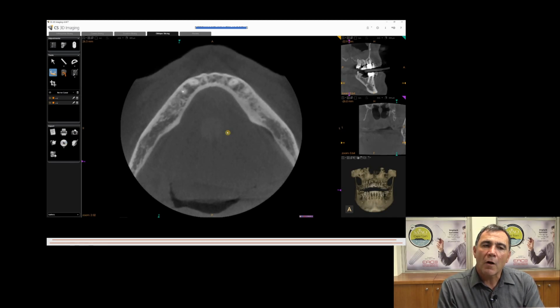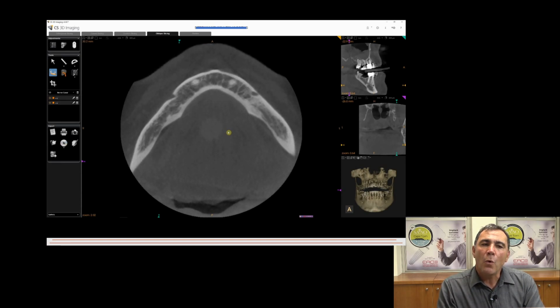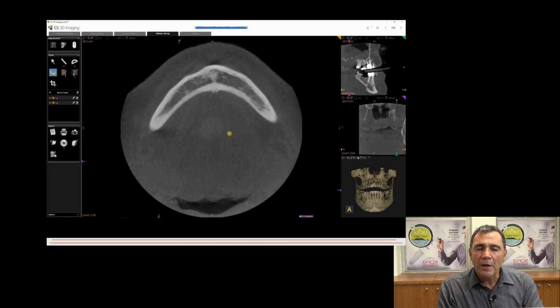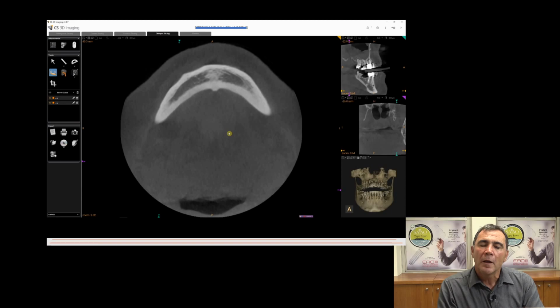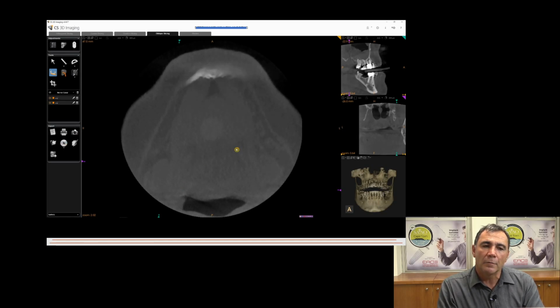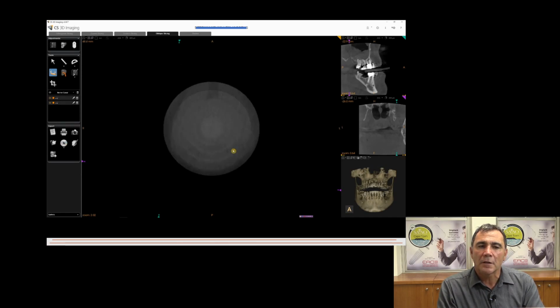And then we go right through the image in the axial view, all the way through the mandible. You can see any other pathologies at this stage. I always say I look for major things whilst I'm going through here, but I make detailed notes of what I see. That is the soft tissue, the suprahyoid muscles, the submandibular glands that you can see in this image.